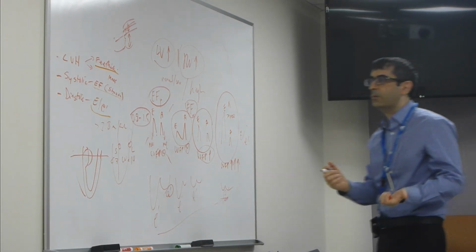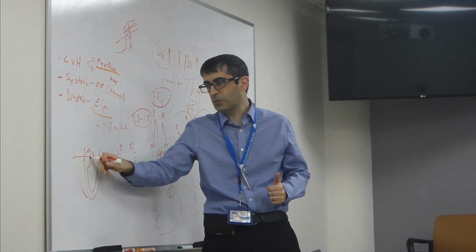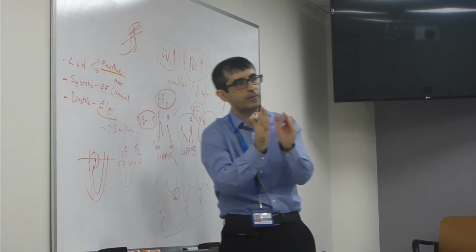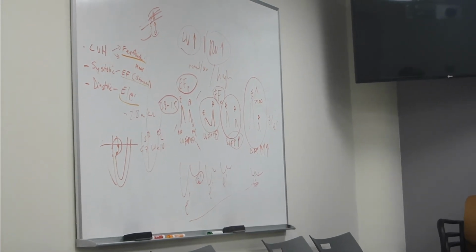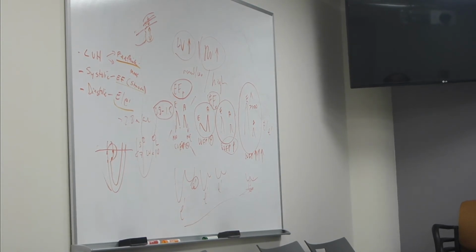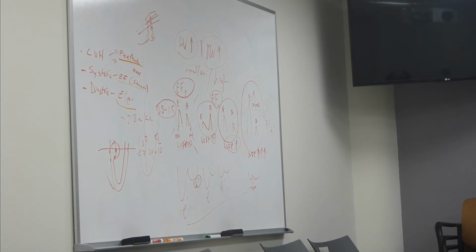And then when you have this sigmoid septum, sometimes you don't know where to measure. Should I measure right at the mitral valve tips, where it's thicker, or go a little bit further down where it's thinner? It's a bit tricky. So the standard of care is the posterior wall. Studies are different, right? Some studies use both, but if you're measuring for study purposes, I would do both, because you're not losing anything.